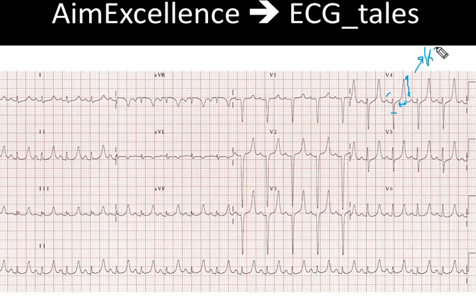We are going to keep this particular discussion very concise, as time is very limited for most of the examinees right now, and we are going to mention only the important points in this ECG. Here, this is the striking finding that is seen. This is a tall peaked T wave, and other findings are not seen here. But this is the first change that happens in the ECG.